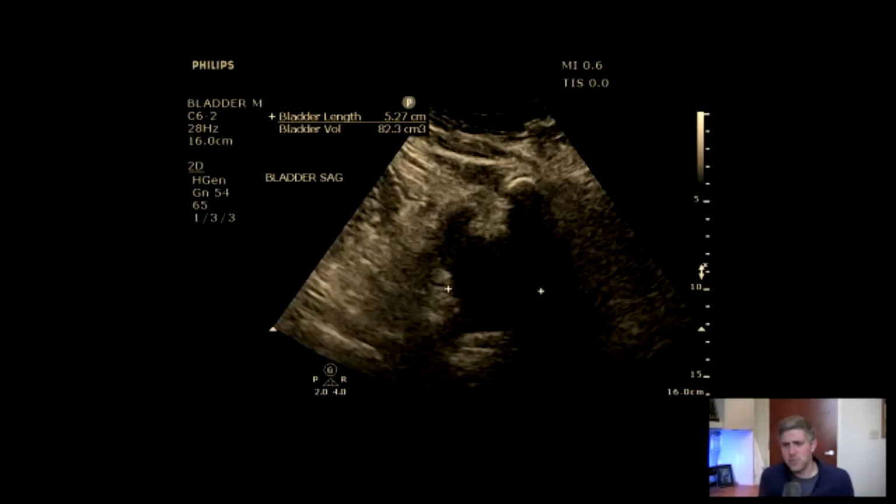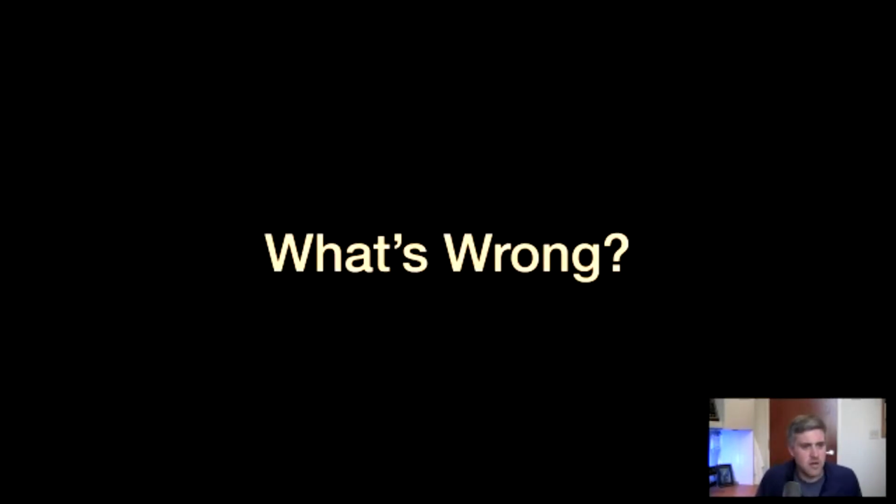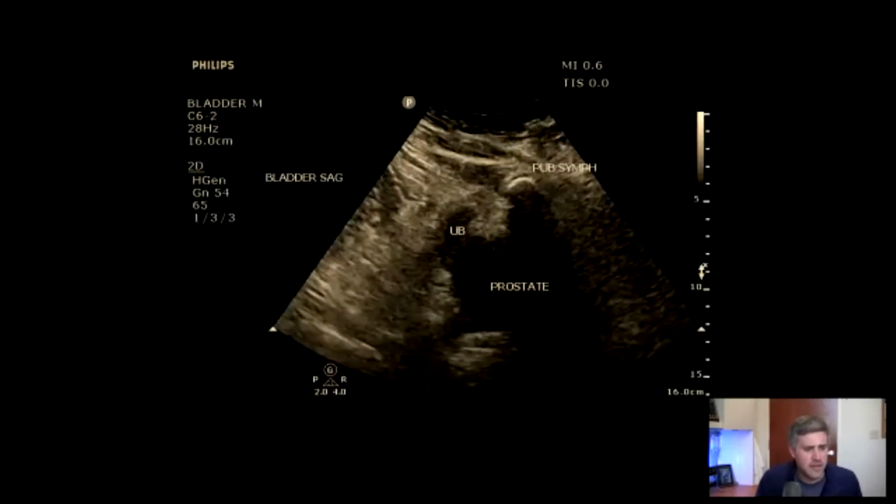You guys happy with that? You cool with that? You good? You want to move on? All right. So the question, again, I bring this up in pitfalls, so there must be something wrong with this one. What's wrong with this study, right? And let me put some labels on this, and we'll kind of walk through this one a little bit, and it'll make more sense. What we measured, or I should say what was measured in this situation, was the prostate. Okay, now it's a very large prostate, but it was the prostate nonetheless.